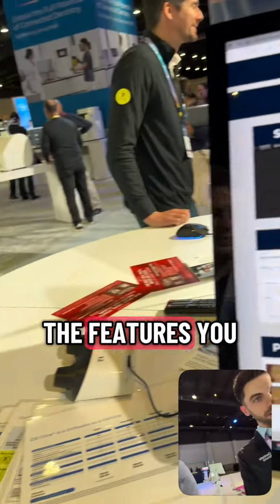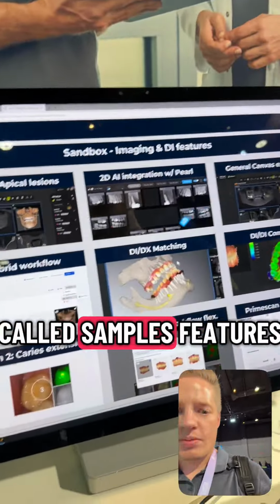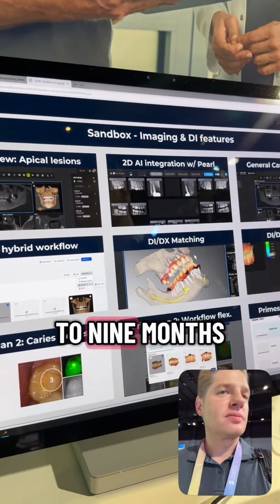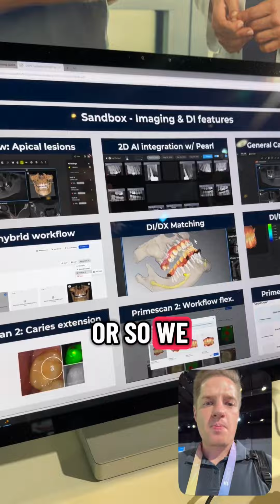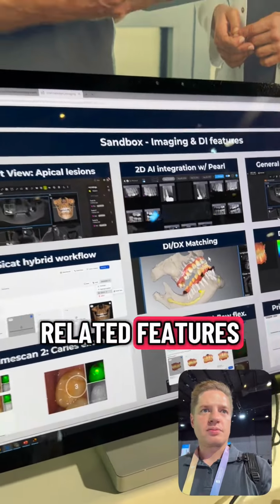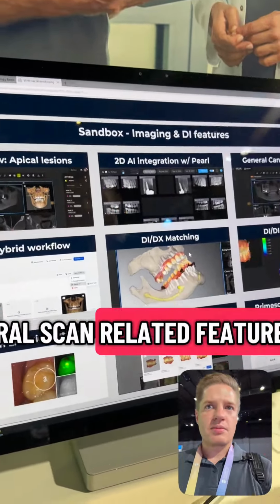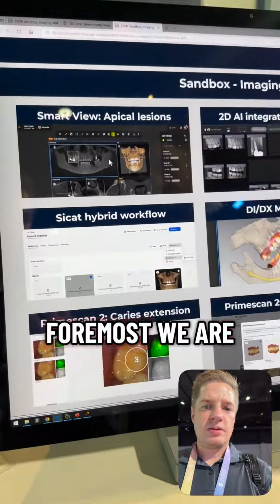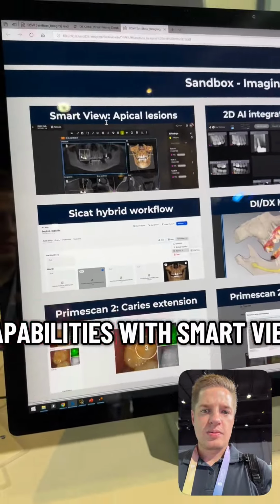So all of the features you see here, those are our so-called sandbox features. They are features that will be released usually in the next 3 to 9 months also in DSCore. So we have different kind of X-ray related features, we have intraoral scan related features. Just showing you the broad overview right now. So first and foremost, we are extending our AI capabilities with SmartView.